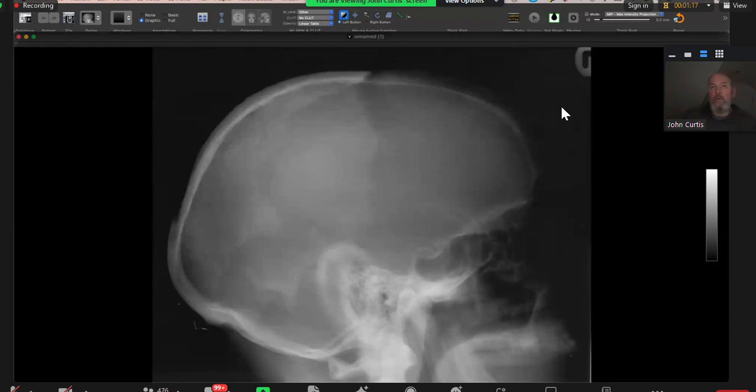Okay. What's the diagnosis here? I'm provided with the lateral radiograph of the skull of a skeletally mature patient, in which I can appreciate that there is a lucent area noted along the anterior aspect of the frontal and the parietal bones.